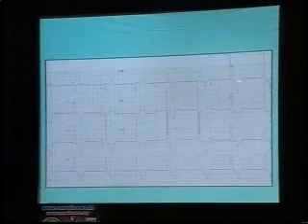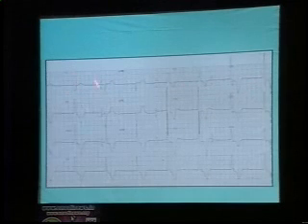Absolutely right. You see there is a right bundle branch block. V1 is right bundle branch pattern. Lead 1 is negative. That means there is a left posterior hemiblock. So the patient has an underlying conduction system disease. And whenever you see atrial fibrillation, whenever the atria is fibrillating and the ventricle is at a fixed rate, there is no other diagnosis but an underlying complete heart block. You withdraw the drugs, but in most probability you have to give these patients a pacemaker and the patient improves magnificently. Thank you very much for being an excellent audience.